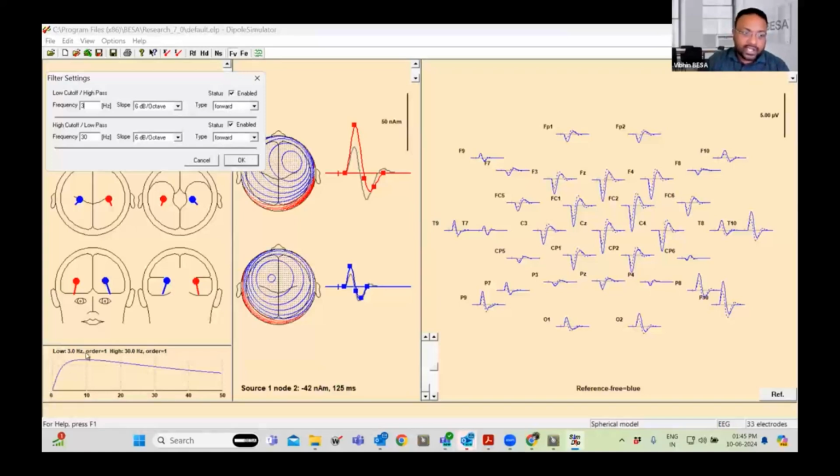But still, you can see that the frequency response, still it's curved, it gives almost a very good cutoff at around 5 hertz or 3 hertz. So if I apply 3 hertz as a cutoff frequency, it doesn't mean that it will actually cut off at that 3 hertz. There can be a slight amplification given to frequencies below 3 hertz and slightly after 3 hertz also. That is why you have this.